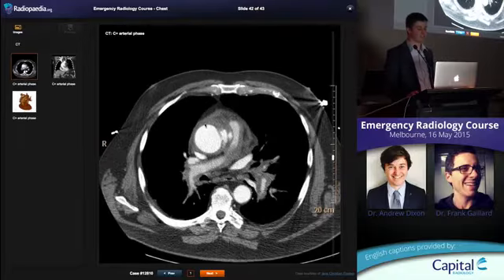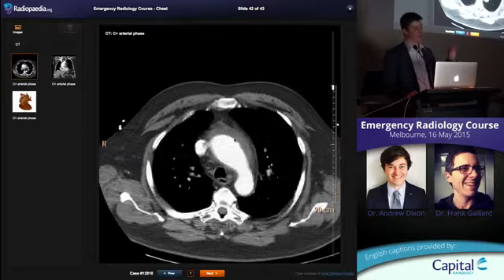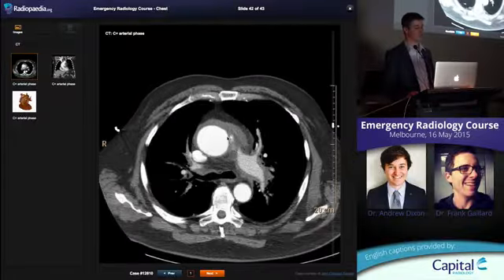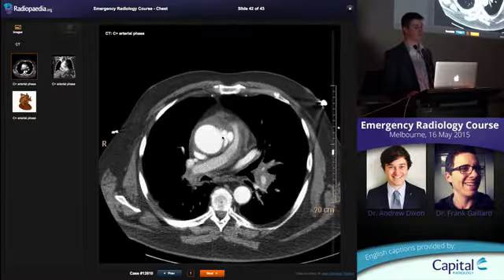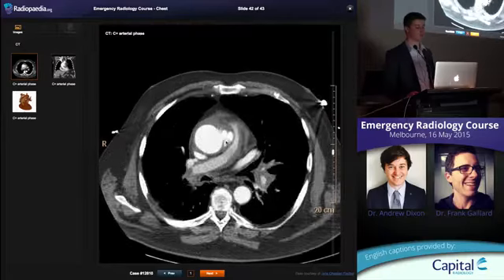And you can see how it's got periaortic hematoma. I spoke about looking at the mediastinal fat earlier. You usually have the aorta, then your imperceptible wall, and then nice black fat sitting next to it. Look at all this periaortic hematoma. Okay, so this patient has a ruptured ulcerating plaque.